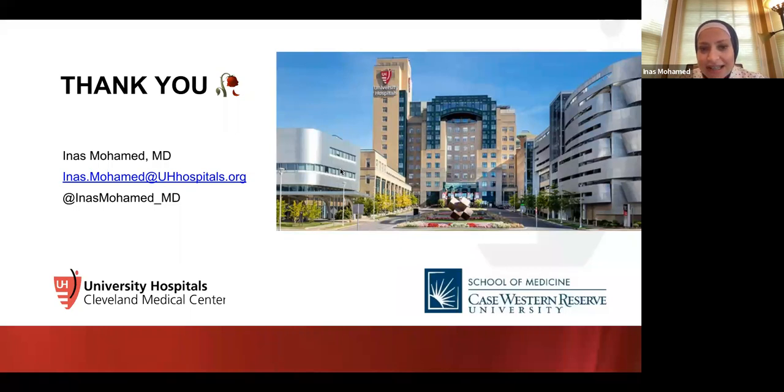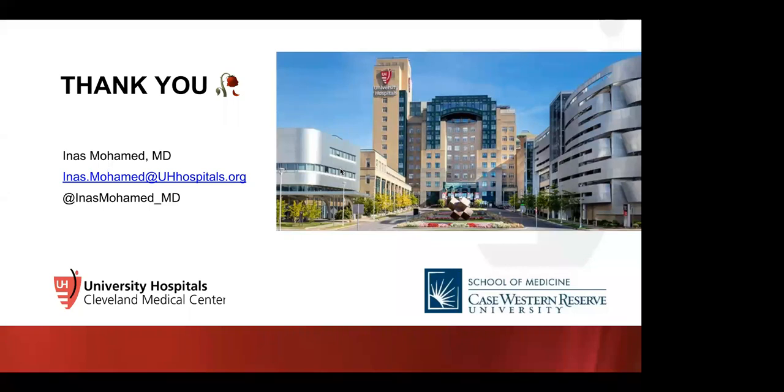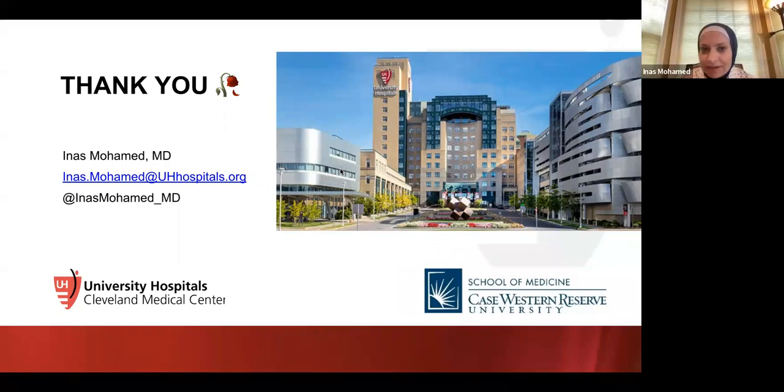Any other questions, Islam? Yes, someone is asking, I could not understand the case of fibrolamellar HCC. Why not cholangiocarcinoma? Well, it's in the differential, but first of all, as I said, this was a young male, and this is a large lesion with a necrotic central scar. It's heterogeneously enhancing in the arterial phase and then washing out. We didn't give a differential for this case.